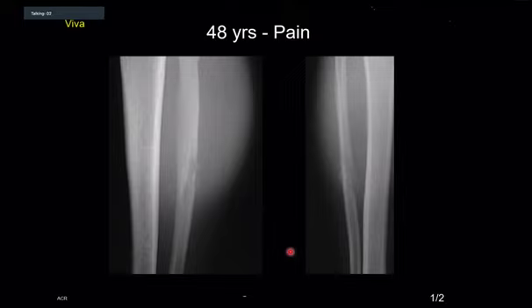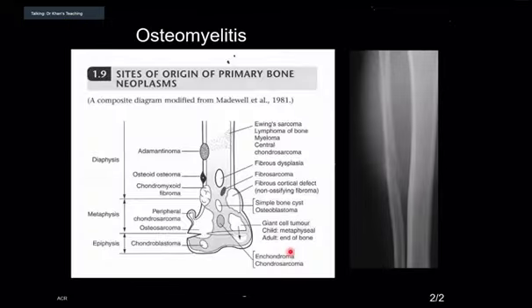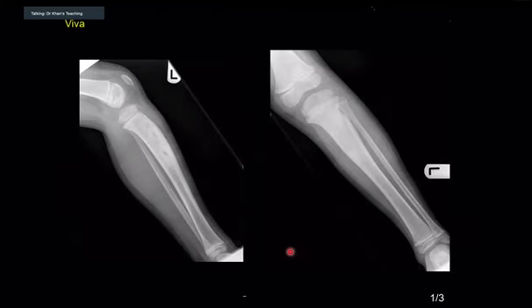In a 48-year-old, my differentials would again include a metastasis, a myeloma, infection, and lymphoma. Lymphoma should be up there. Yes, lymphoma should be up there. Okay. And myeloma, you have to keep it down. Even 48 is a bit young for that. Okay. Anyway, so that was another case.